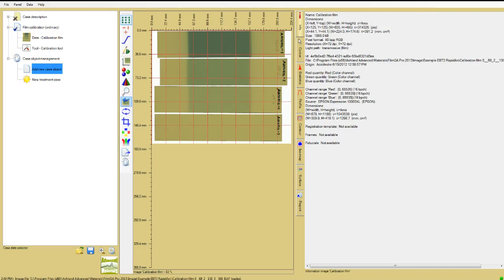We use 4 films here to demonstrate the one-scan calibration protocol, and if you follow the protocol you won't need lots of calibration points. In most cases just 3 are needed, because the asymptotic fitting functions in FilmQAPro behave like film and require only 3 coefficients to be defined. Adding an extra point or 2 helps by providing statistics on the goodness of the fit and allows you to identify bad calibration points and helps in selecting the best fitting function.